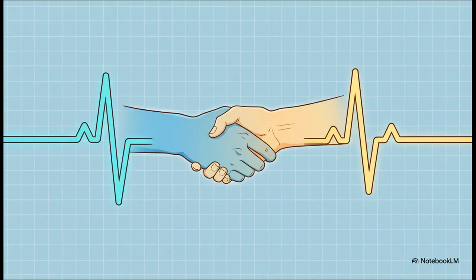Okay, so this is what right axis deviation looks like. In lead I, the QRS points down. In lead 2, the QRS points up. See how they're pointing towards each other? It literally looks like 2 hands reaching out to shake. And which hand do you shake with? Your right hand. So shaking hands means right axis deviation.